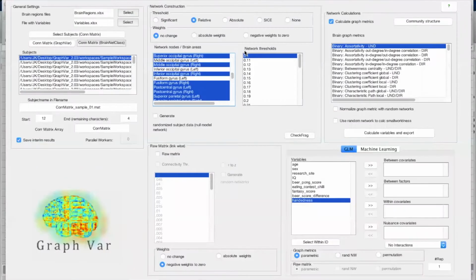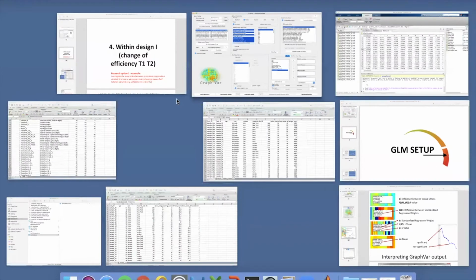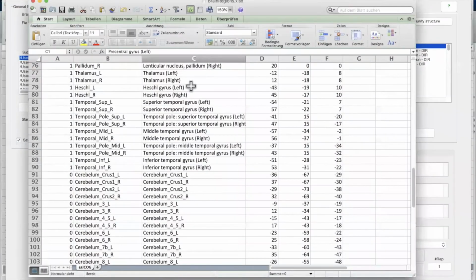the name that you see here, which is the long name, so that you actually know, in my opinion, it was better to give you the long name here so you know what you're actually looking at. This is the one from the third column. The one from the second column we'll use in the results viewer, where we show you then also those specific areas. But there the window is not so big, so it makes sense to have it in a little bit abbreviated form. Obviously, you can also use the same name for those two columns, right?